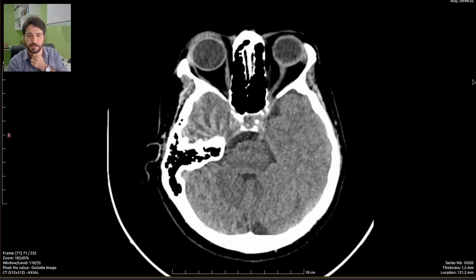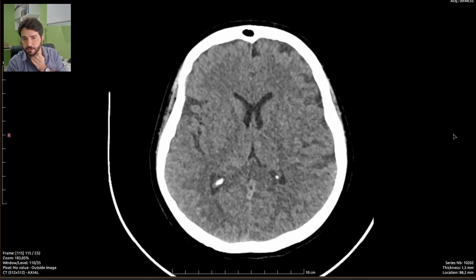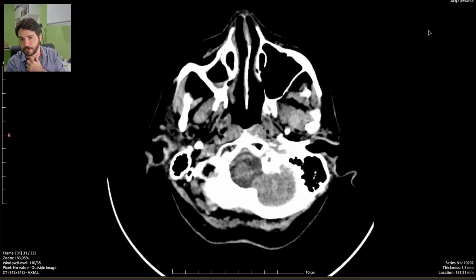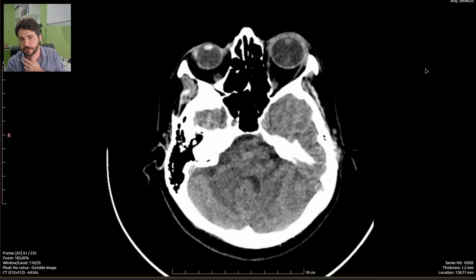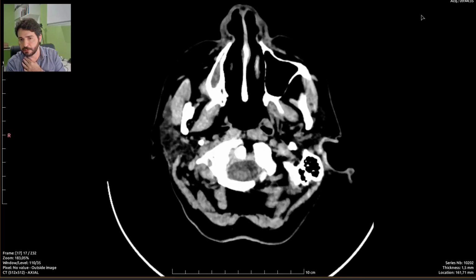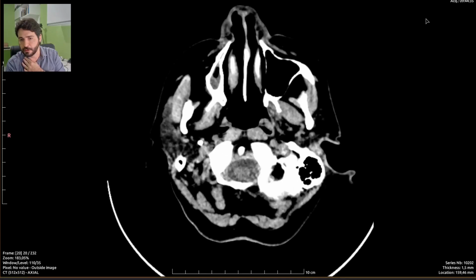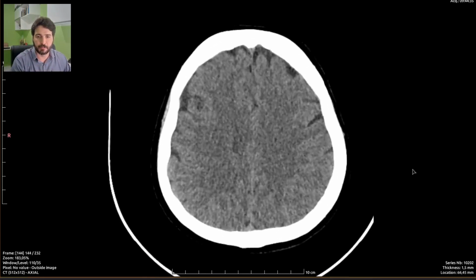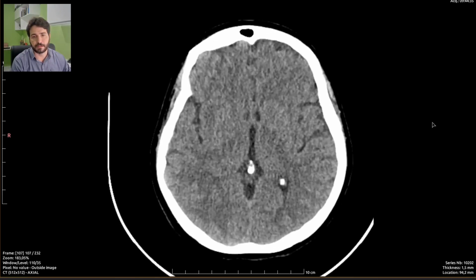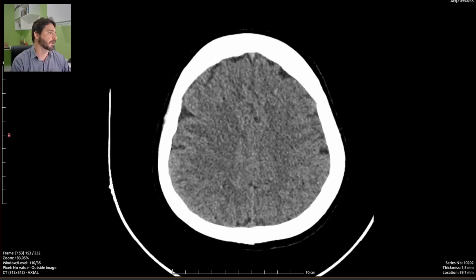I wonder if in the last report another doctor said this patient had any signs of stroke, because it seems she has been admitted to the hospital as if she had a stroke. So let's just see yesterday's report from another doctor, which says she is fine, and I agree, she is fine. She isn't sick. Her brain is just fine.